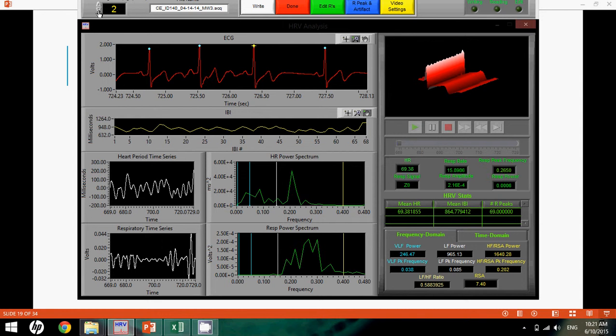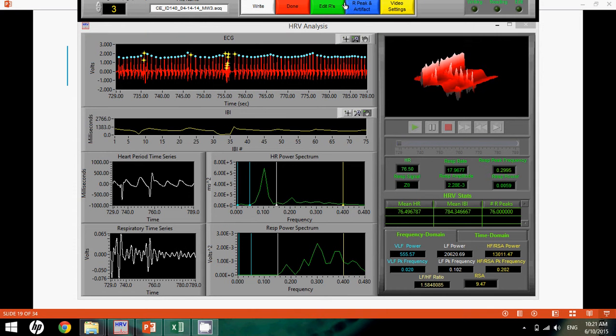This particular file has quite a few ectopic beats, and I'm hoping to provide a number of examples to show when and how to get past those issues. Again, this is not a particular issue to worry about because this is just natural physiology. So in this case, this yellow star is basically not of interest to you.